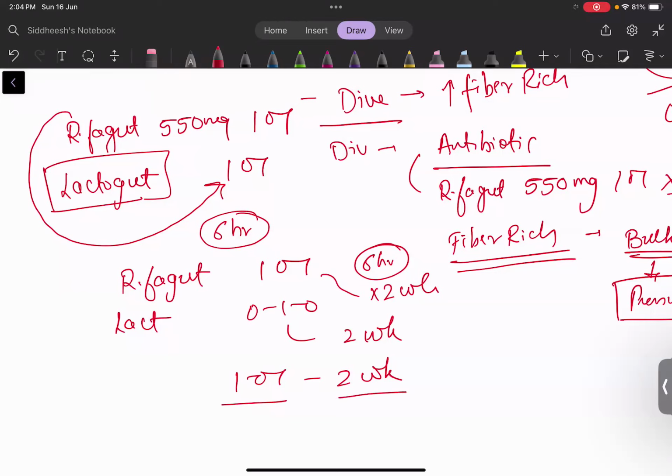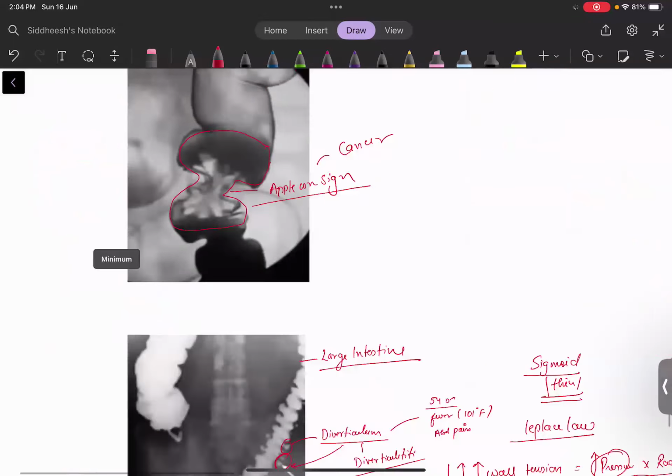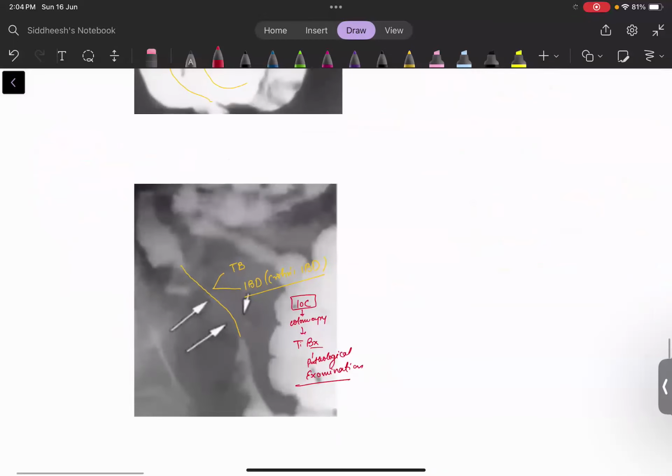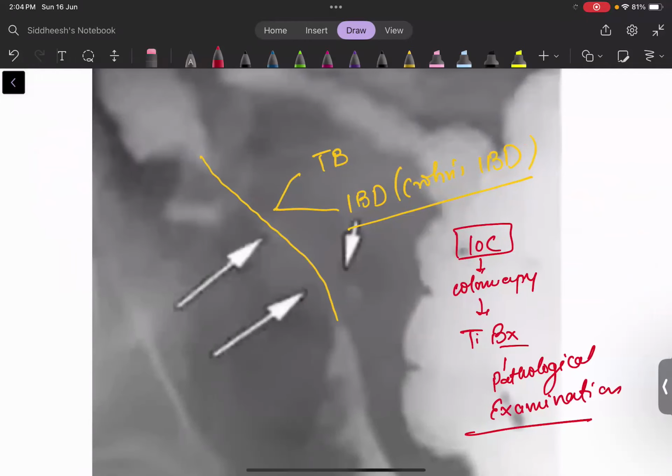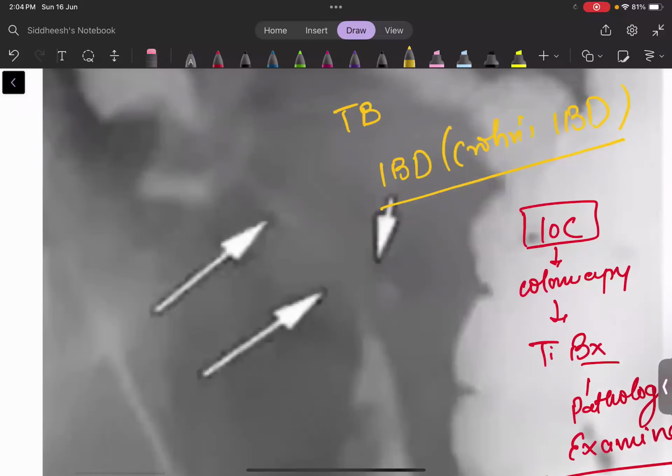Done. And I think someone has asked about Crohn's disease also. Yes, Ashutosh has asked about Crohn's disease. Okay. This is the image we were discussing, Ashutosh. In this part, if you can appreciate the presence of the string sign, just try to follow my marker. This is the string sign. You will notice a fine white line is there. A very fine white line you can appreciate.